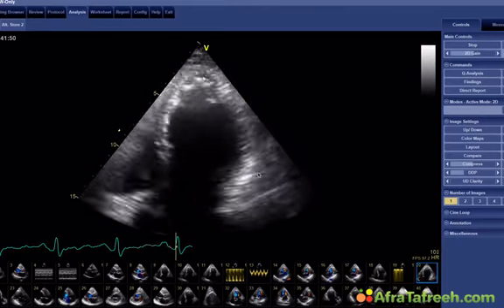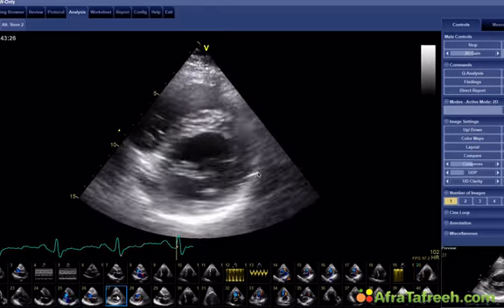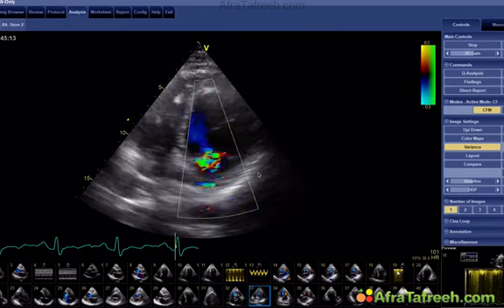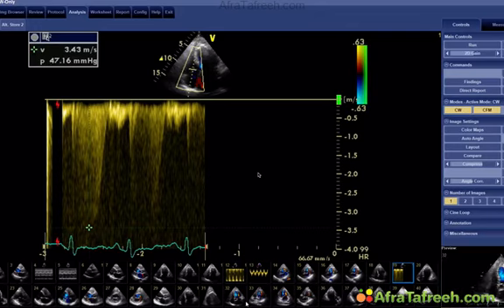And here is just a close-up view of these infiltrates again. Mitral regurgitation, the mitral valve again. Okay, otherwise nothing much different. Here is just the tricuspid regurgitant signal. You can see that the patient has fairly high pulmonary pressure. If you add maybe 10 to this for the right atrial pressure, we're somewhere in the range of 57 to almost 60 millimeters of mercury. Okay, we just got a question in from Yvonne again. She asked if there could be a flail leaflet or chordal rupture. Good question.